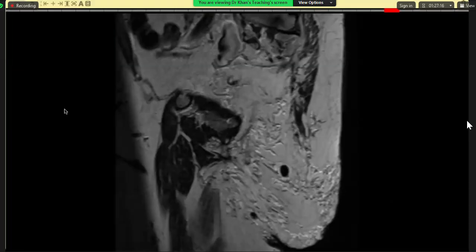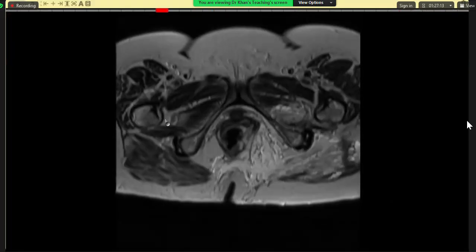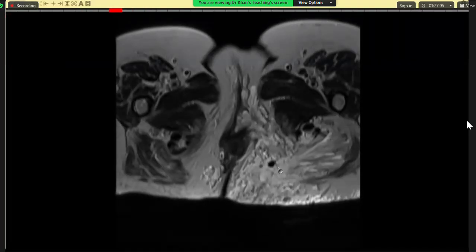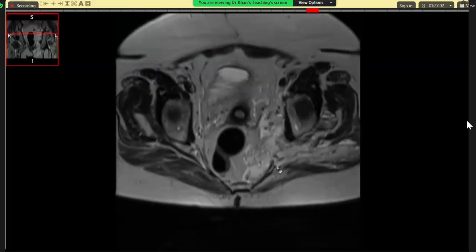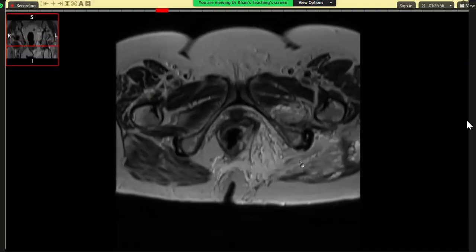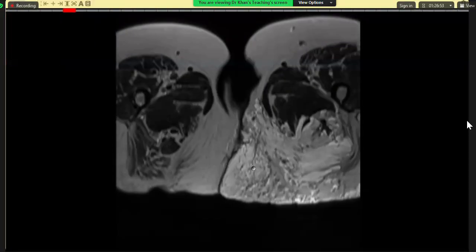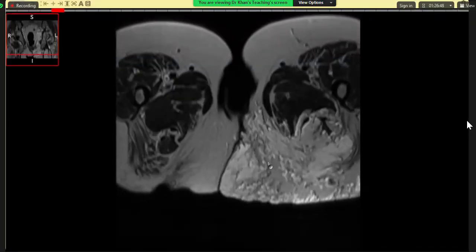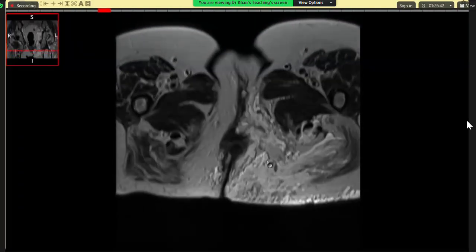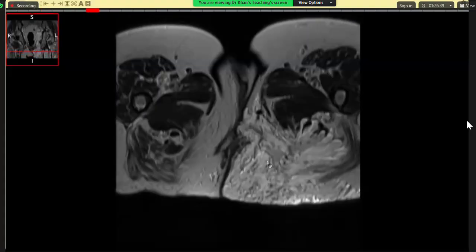Now this T2 is pathognomonic on a T2 weighted sequence. What is the role of Doppler? These are vessels, and these are phleboliths here. In Doppler, the technique is, if you can reach it, these deep ones of course you cannot, you compress them and they will be compressed. That confirms that this is a vessel, a vascular malformation and not a mass per se. That was the question I was referring to.